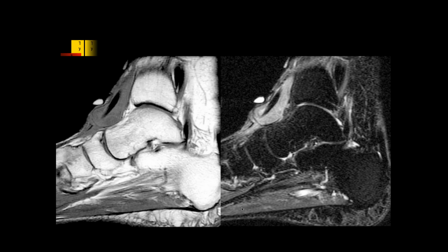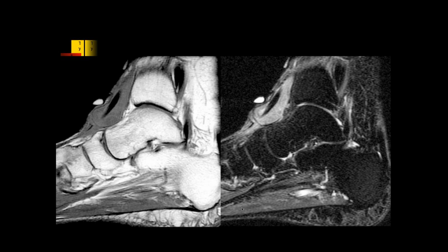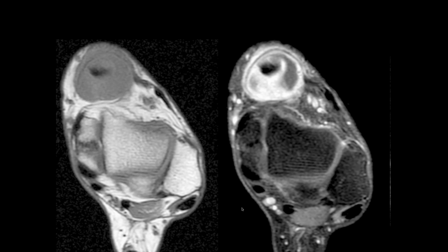Yeah, right. Exactly. Michael, what do you think here? So we have a soft tissue marker overlying one of the anterior tendons, which I assume is the anterior tibialis tendon. Right. And there's all this soft tissue signal around it. I don't know if it's just a cut on the sagittal, if it's torn or not. If not, this might just be like marked tenosynovitis.